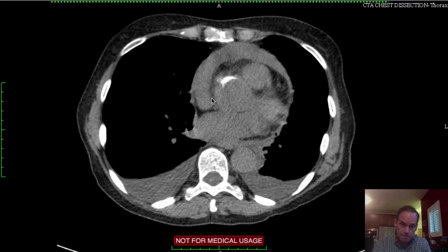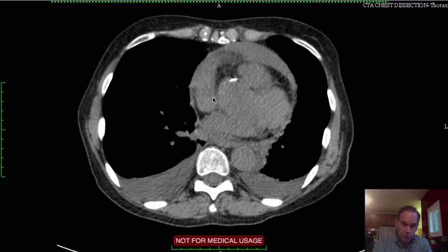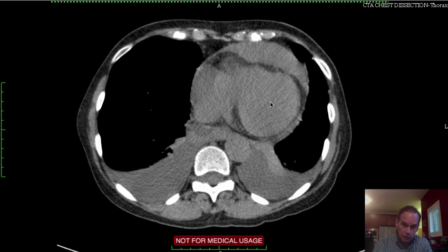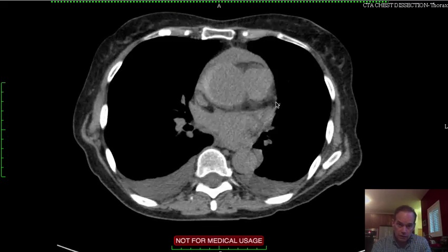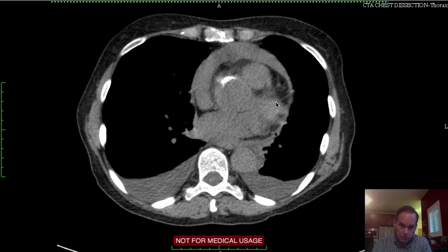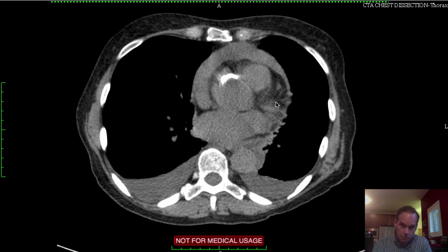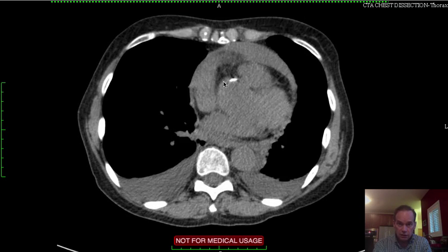Okay, and here we have the left ventricle here, and I'm giving away some of the secrets of this case now. Here's a calcification. Where is that? It's an intimal calcification in the ascending aorta.